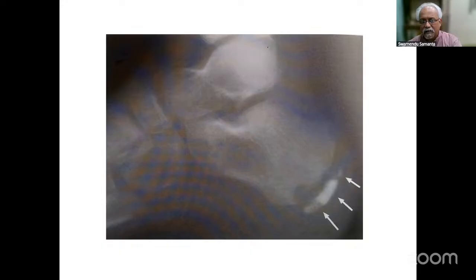Calcaneum fracture. What? Sever's disease. This is a fracture. Come on. Sir, Sever's disease. Okay. Read all this sort of thing, the Freiberg and all this. So someone has written shivers. That's not shivers. That's not Severs. S-E-V-E-R-S. Sever's disease. Yes. The spelling should be correct. Okay.